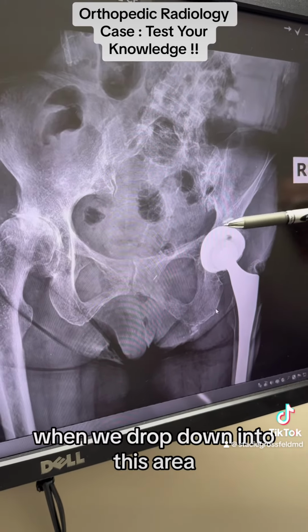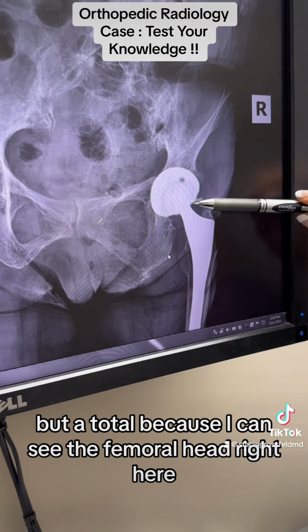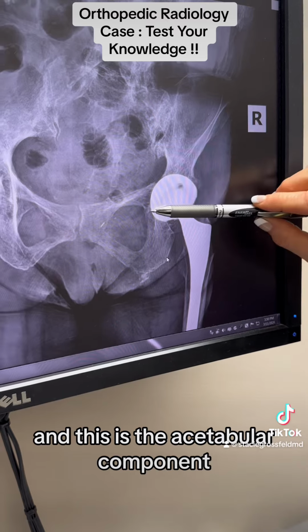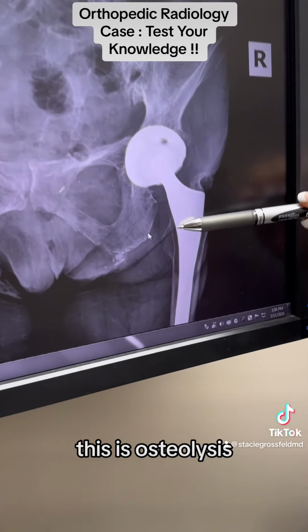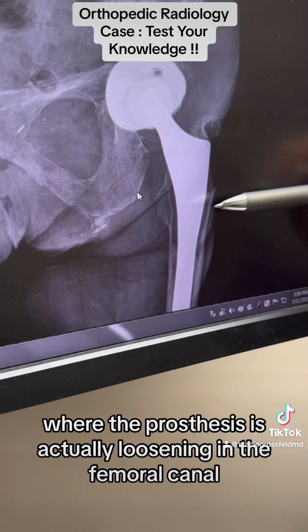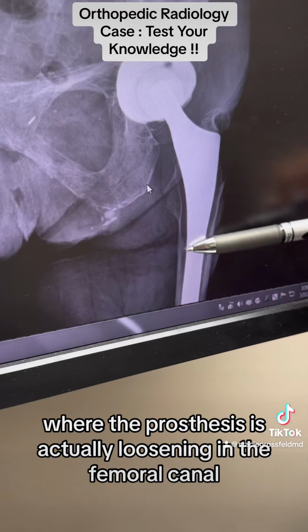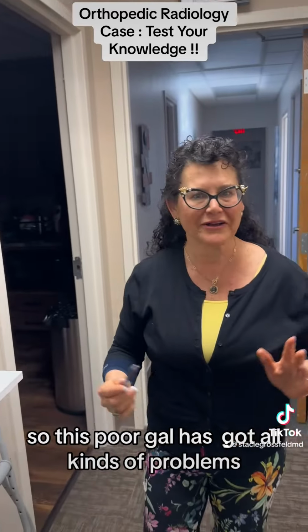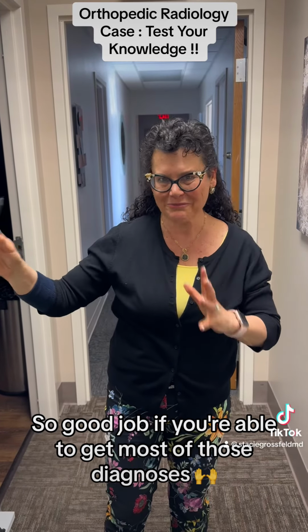When we drop down into this area, this is a total hip replacement, not a bipolar, but a total, because I can see the femoral head right here, and this is the acetabular component. And if you're really, really good at reading x-rays, this is osteolysis, where the prosthesis is actually loosening in the femoral canal. So this poor gal's got all kinds of problems. So good job if you're able to get most of those diagnoses.